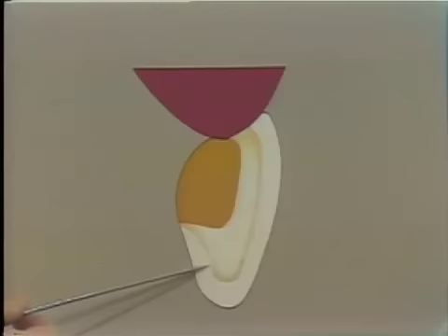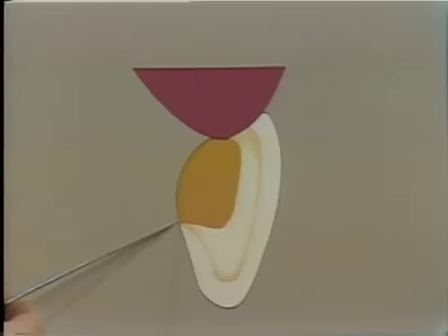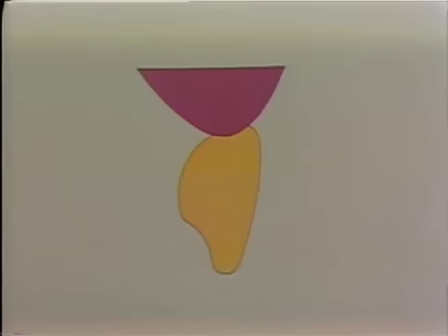And notice how you have a feather edge as the porcelain tapers off to a fine edge, quite distinct from normal relationships of porcelain to gold. And the same thing happens all the way down here. So I think if that just fades in and out a little, we can recognize here the relationship between the gold core here and then the porcelain which is built onto that and brought round interproximally, but the gold core is left exposed interproximally here to allow for soldering to the retainer or to the next Pontic.